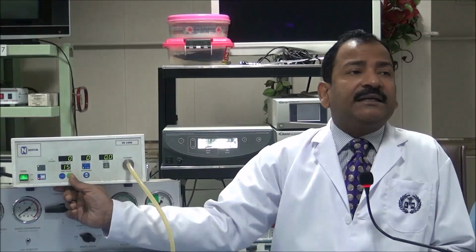If you are performing some advanced surgery where a lot of omentum fat is there, like bariatric surgery, in the female patient most of the fat is outside the body. But in the male, most of the fat is inside the abdomen, in the omentum. So due to that, vision is very much difficult. Reaching to that hiatus, reaching to the gastroesophageal junction is very difficult.